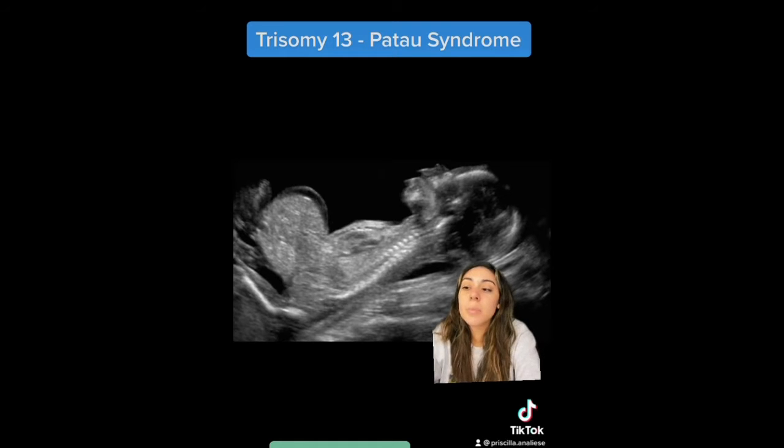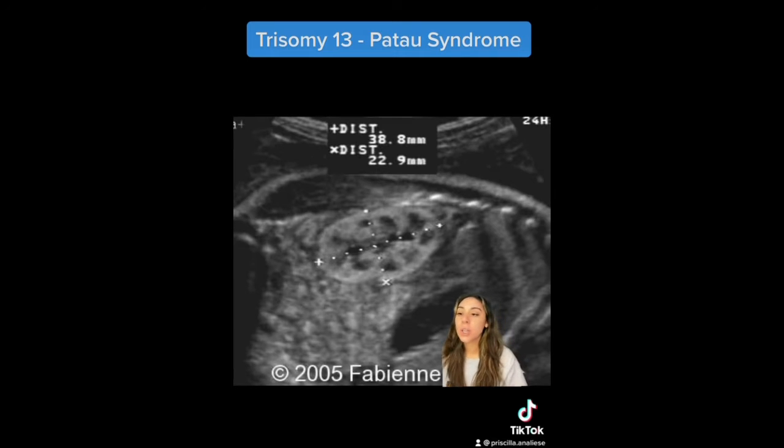Our next physical feature is omphalocele, and it is an abdominal wall defect in which abdominal organs are atypically located within the umbilical cord. Basically, it's just when the bowel does not return to the abdomen. It is encapsulated by amnion and peritoneum. Sonographically, you would see a bulge near the abdominal region. And the last most common physical feature is renal abnormalities. This one is very echogenic. The prognosis for this syndrome is very poor.